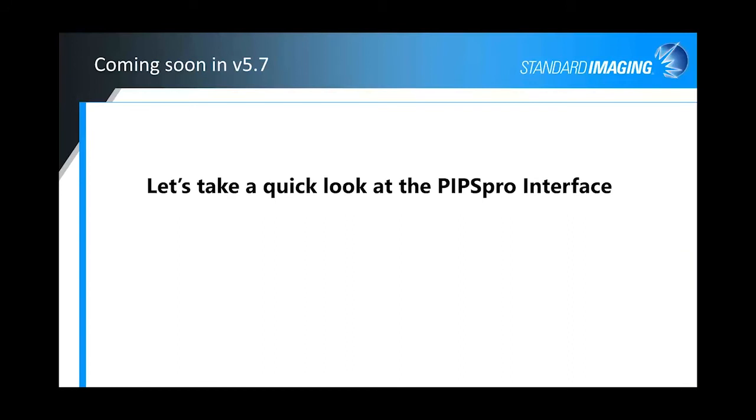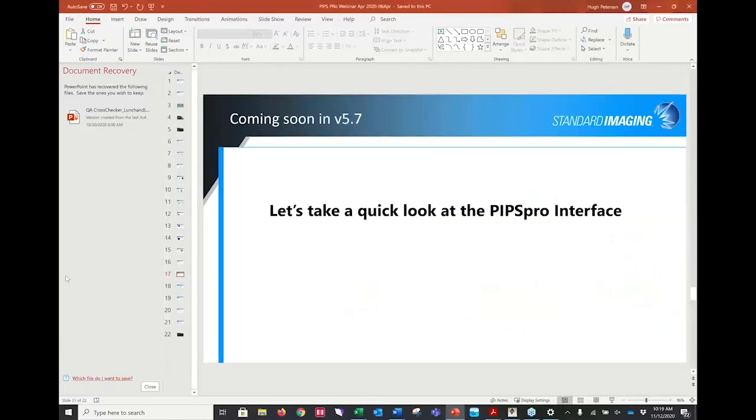So I'm just going to jump into the software real quick, give you a couple of examples to show you how easy things are. I don't want to spend too much time. I usually keep these to about 25, 30 minutes, so I'm at about 19 minutes now. So, another 5 or 7 minutes and we'll get you back on your day. Let me grab the software here.